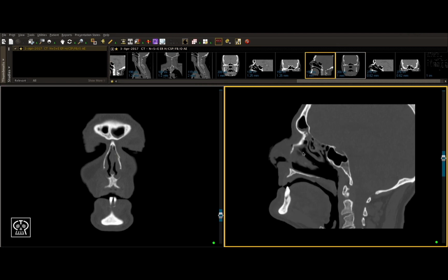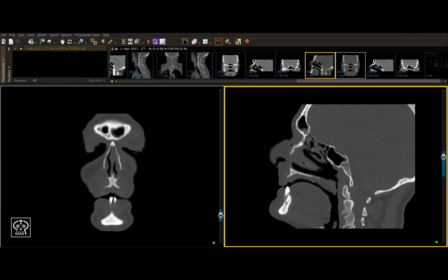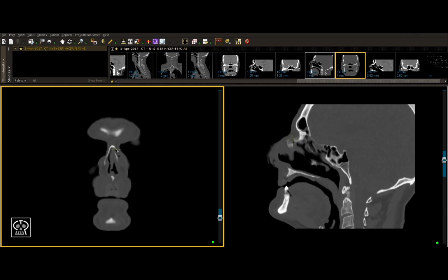First, here we can see the fracture we were speaking of before in the frontal process of the maxilla. And then we can also see the break in our left nasal bone. It's difficult to see on the sagittal view. It's much easier to appreciate on the axial and coronal views. But that's why it's always important to look at everything in 3 views. As you begin to look at more and more sagittal views of the nasal bones, you'll become more and more familiar with how it looks with the fracture and how it looks when it's just normal anatomy.